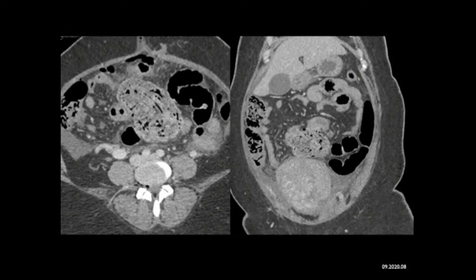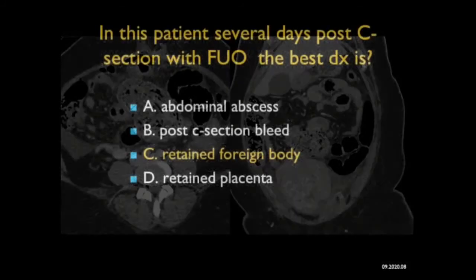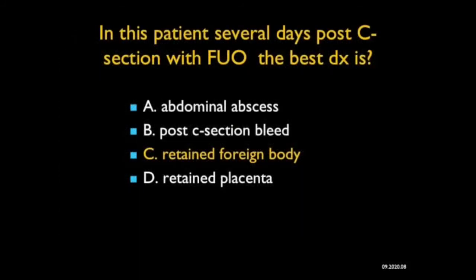Again, foreign bodies are not uncommon. They present with FUOs commonly. They can be confused with tumor recurrence, unopacified bowel, or an abscess. Remember now, we like to have rings on towels, and this was not a ring, so many things wrong. But again, it's something you need to be very careful about, and you want to make the diagnosis, and this will need to be removed, but you don't want to miss the diagnosis.